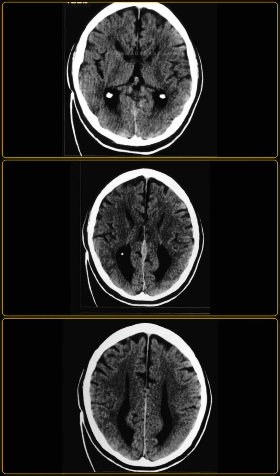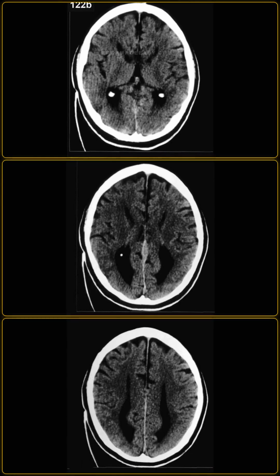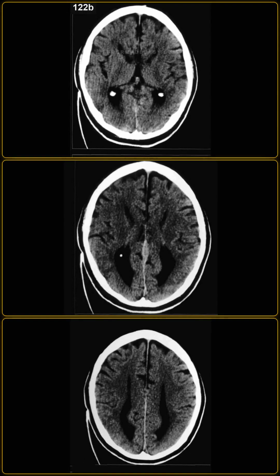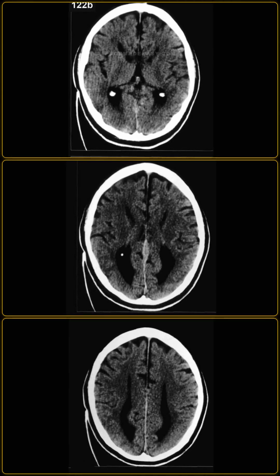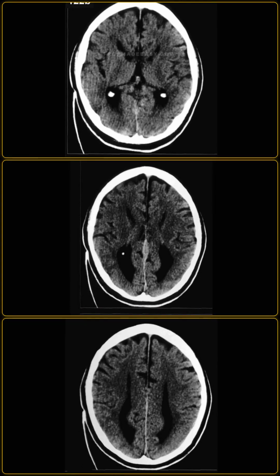I am showing you axial brain CT images from a different patient. What do they demonstrate, and what is the differential? The comparison brain CT scan demonstrates similar features with widely separated, parallel lateral ventricles, showing a classic bat's wing configuration. There is also colpocephaly with prominence of the posterior horns and a high-riding third ventricle.